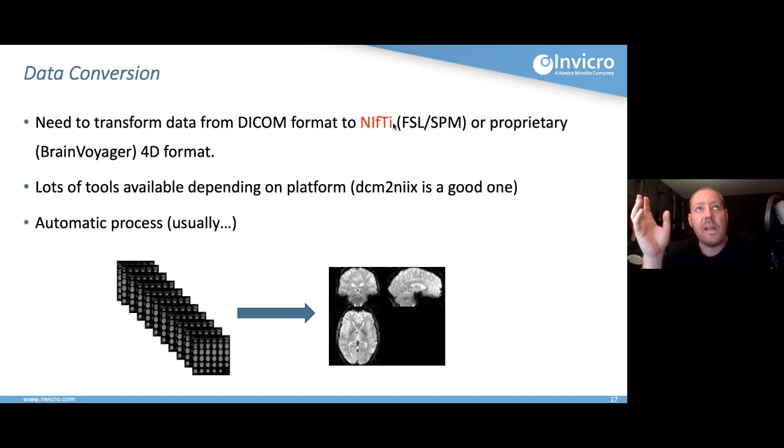So basically NIFTI strips out all of the junk header information from the DICOM format that we don't need and packages it up in a more easily portable and convenient format. Essentially, it takes that set of 3D images and produces a single 4-dimensional image, meaning you have your 3D volumes represented across time as well, but in a single file.